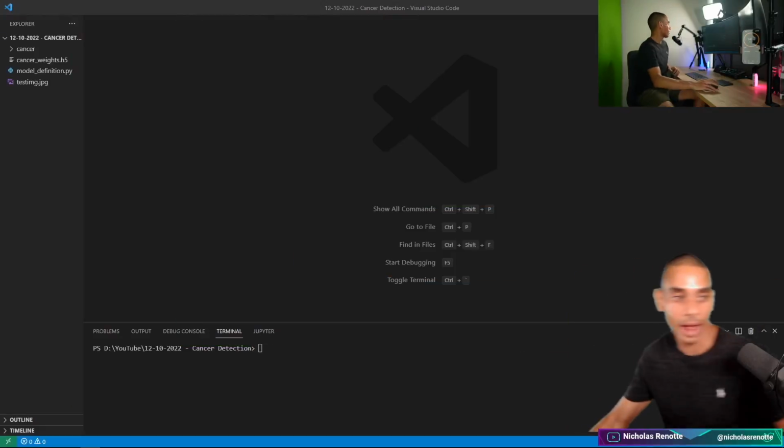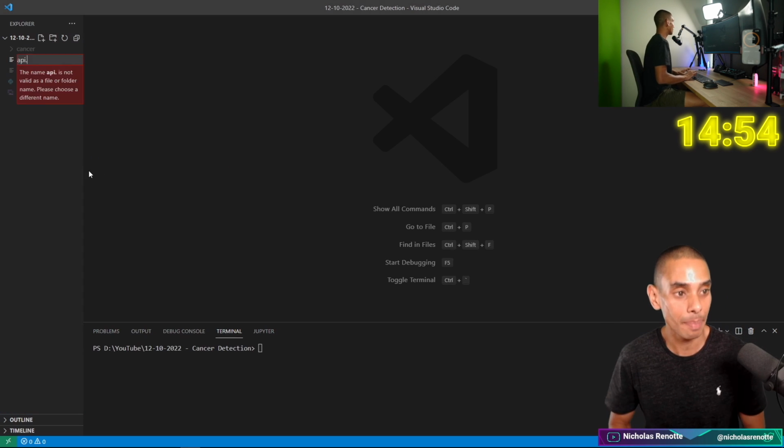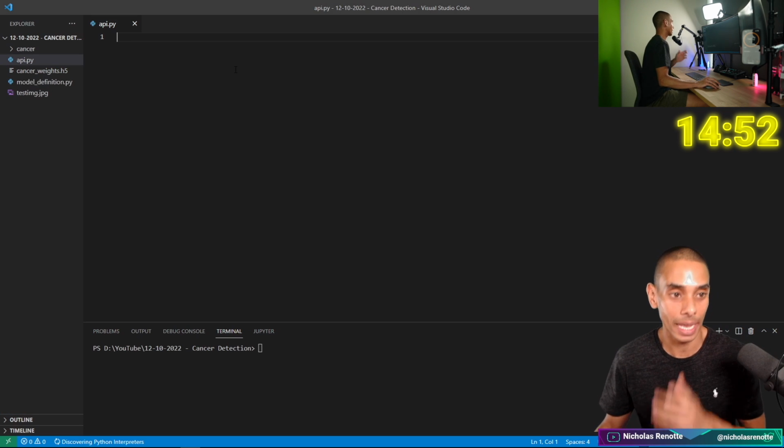Alrighty guys, 15 minutes on the clock. Let's go. All right, so first thing that we need to do is create a new Python file, and we are going to call this API.py. And then we've got to import a couple of dependencies.